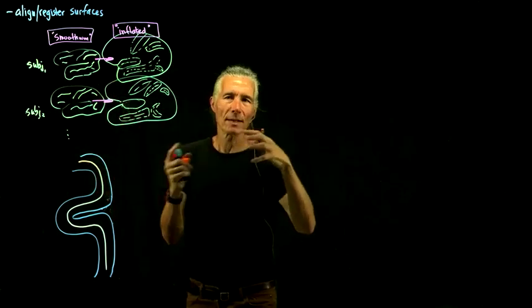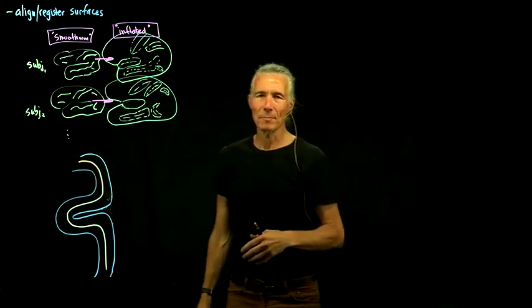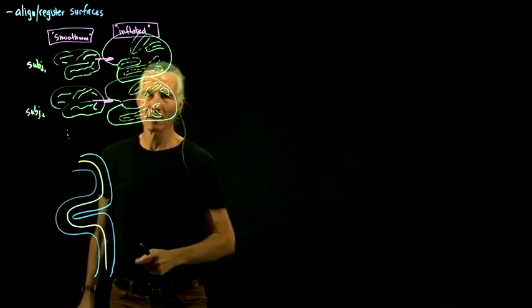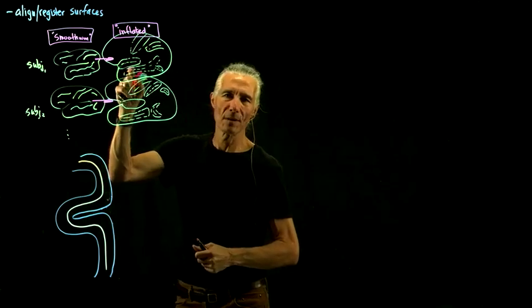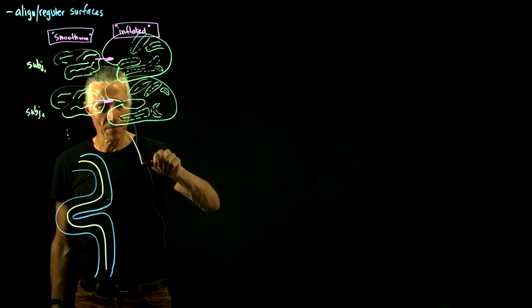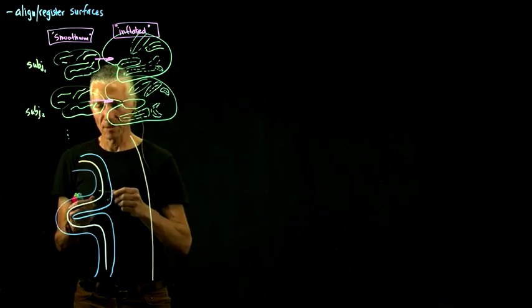It looks like it's got about twice as big, something like that. Maybe 70% of the cortex is down in the folds. So you inflate it, you get a surface like this, a nice smooth surface.